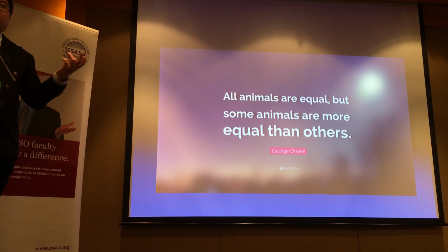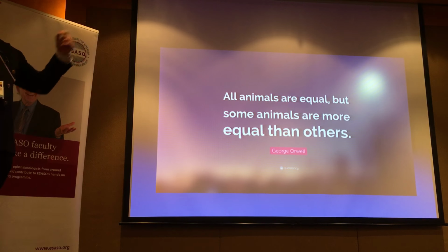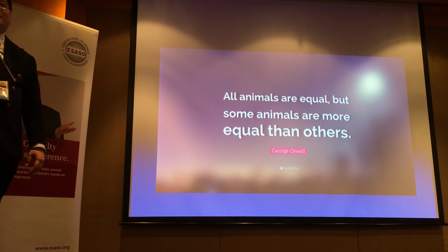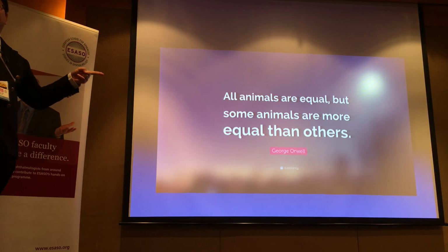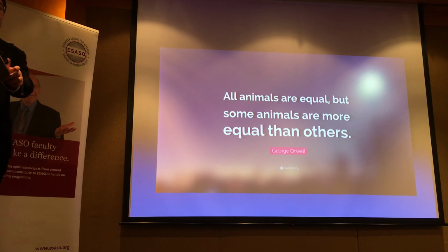During some imaging rounds, it's usually the juniors who make the mistakes. They'll say, this patient has hard exudates there, as shown by the hyperreflectivity. And sometimes I just can't stand it. I cut in and say, how do you know those are hard exudates? Could that not be a scar? I say to them, not to be mean, but Srinivas Sadda, one of the foremost experts on OCT, just says it's hyper or hypo. He doesn't just look at one thing and say, that's a hard exudate. So why is someone very junior doing that? So be careful, it's not all the same.